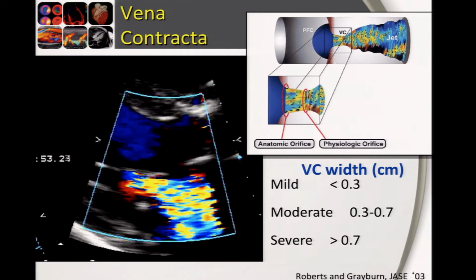Most of the error people make is they measure above the leaflets. That's why you toggle color on and off if you're not sure. Have a side-by-side with and without color, and then it's usually much more obvious.